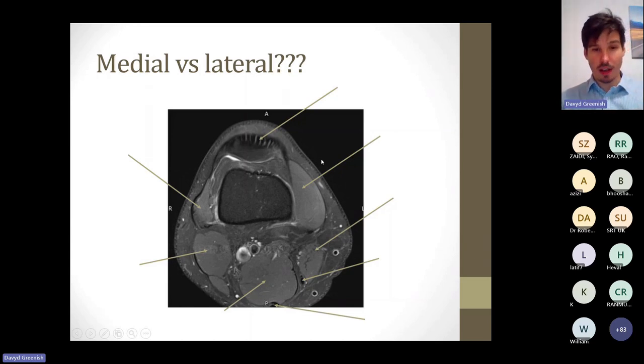And again, another one where I think it's quite hard. When you've got a tibia and fibula, you think that's fine, that's easy. But at this level, you don't have that. So we're a little bit higher up actually here. We start at the top. What structure is this here?